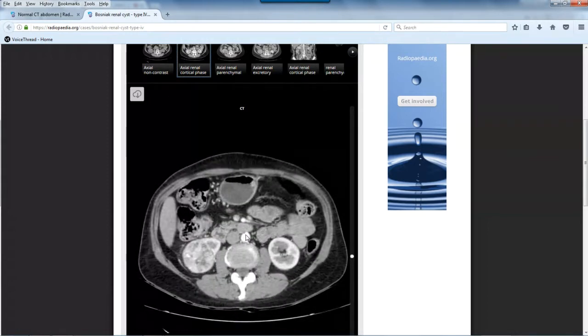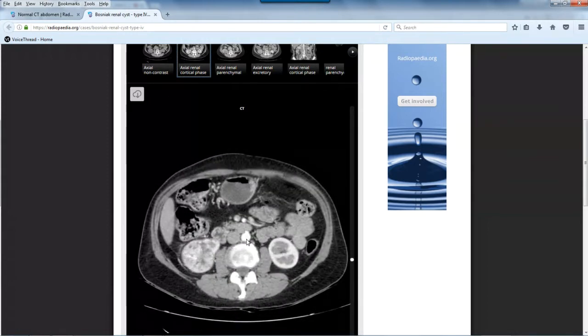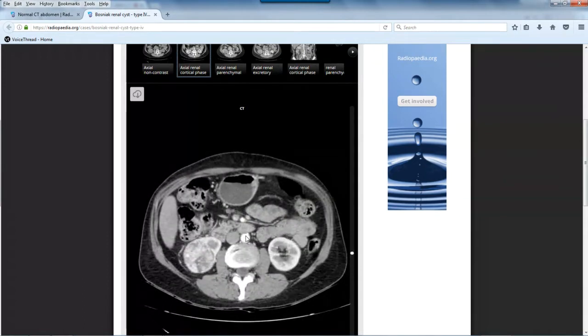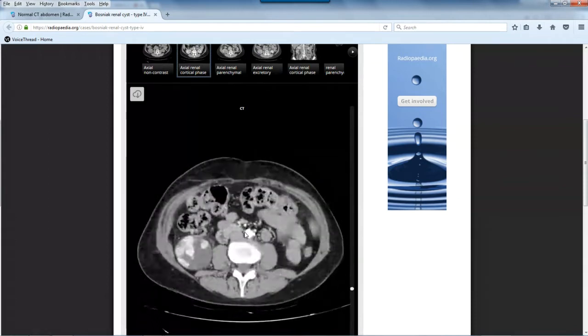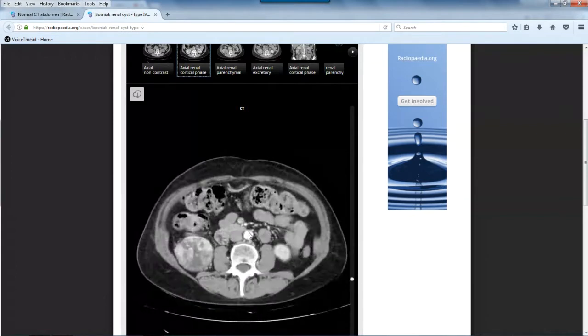It's one that you should be able to at least know where it is. Here you should know that that calcification is where it should be branching off, and it's still there. It doesn't look like it's completely occluded, but it's going to slow down the blood supply. So that's your IMA.